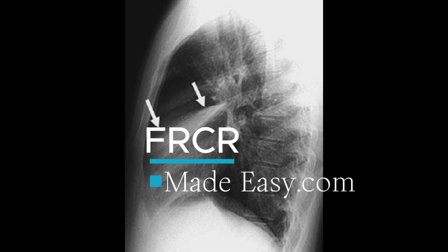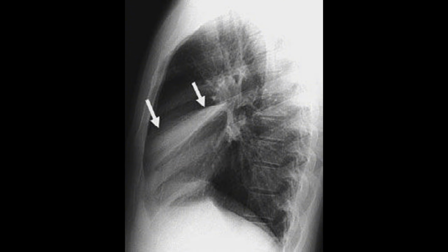In summary, this case demonstrates a right middle lobe collapse secondary to mucus plugging in a patient with asthma, with classic findings of a triangular opacity effacing the right heart border on the frontal view and a dense triangular retrosternal opacity on the lateral view, a highly characteristic and important pattern to recognize in the exam.